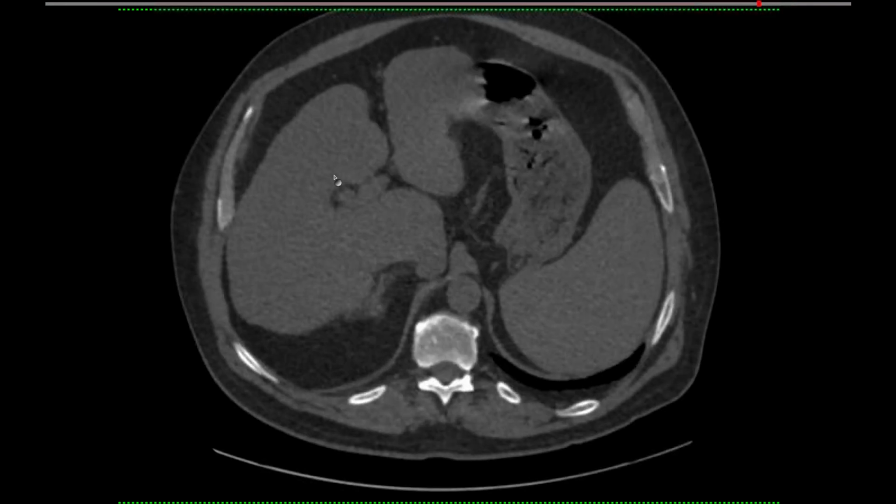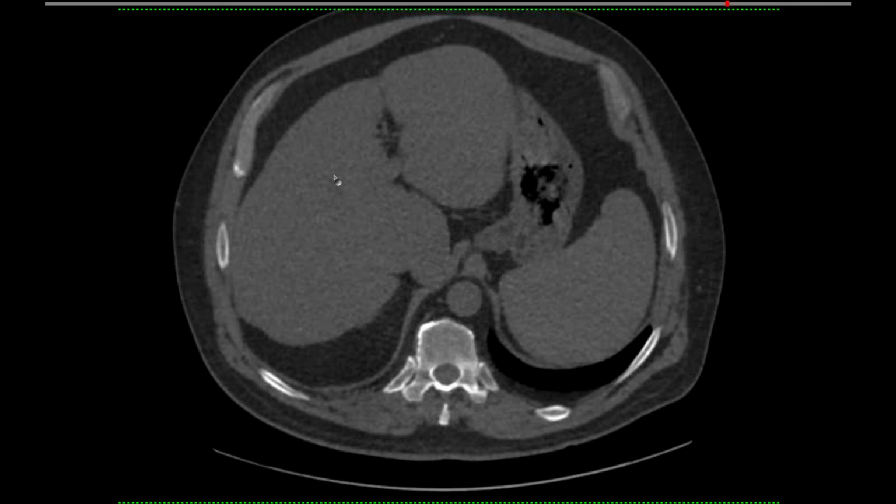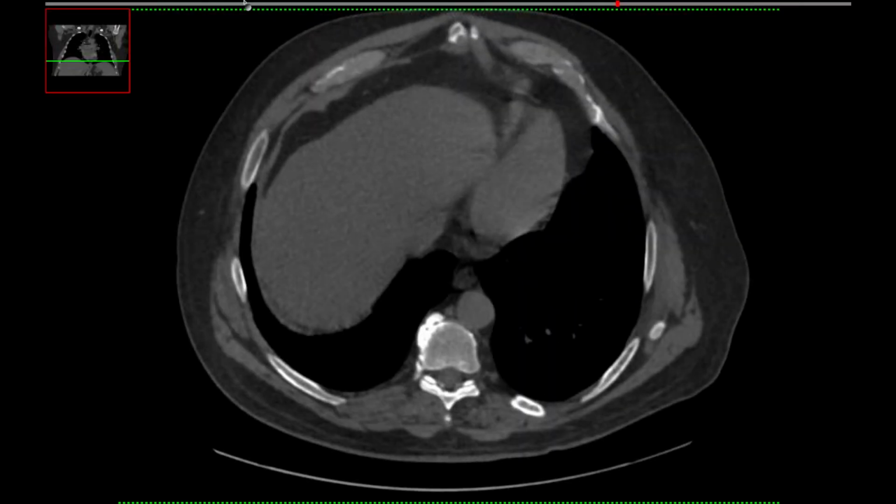And they're sometimes a little bit warm on PET. We would never do a PET for this, but sometimes you'll see a little FDG activity. Of course, tuberculomas can look like this as well, but this still meets criteria for a benign pattern of calcification, with no point in following them even though they're going to get bigger. But out here in the Midwest, these are histoplasmomas.